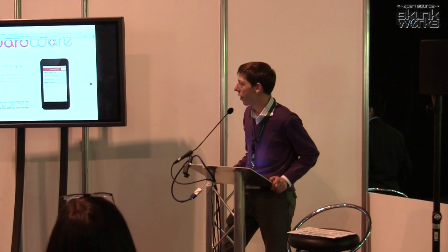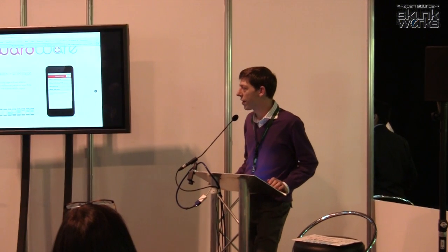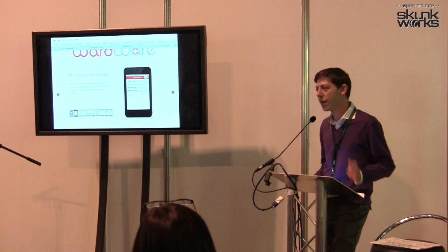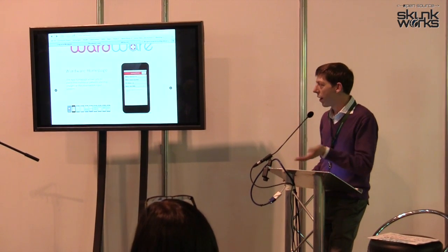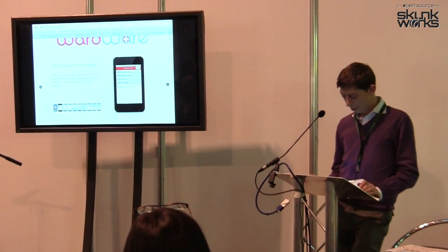So when a nurse is using this on her mobile device or his mobile device on a ward, the first thing that they'll see is a list of patients that are on the ward for them. Now this information is coming from the Trust PAS, so it's fully integrated with the existing clinical systems in a hospital. So all the patients, as soon as they're admitted and transferred onto a ward, they pop up on here waiting for a nurse to do the observations for them.